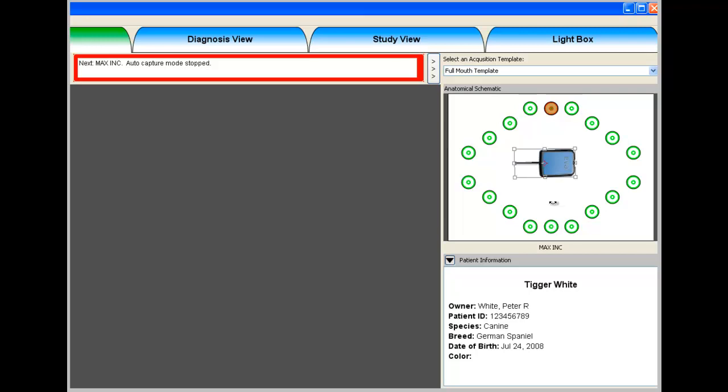Now this is really pretty much exactly the same as with the modified triadan system, where we have 4 quadrants. We have quadrant 1, which is to our upper left on the chart, and that representing the upper right teeth of the dog or the cat. Quadrant 2, which is our upper right, which is the upper left side of the dog or cat. The lower left side down here being quadrant 3, and finally the lower right side being down to our lower left, representing the lower right mandible or quadrant 4.